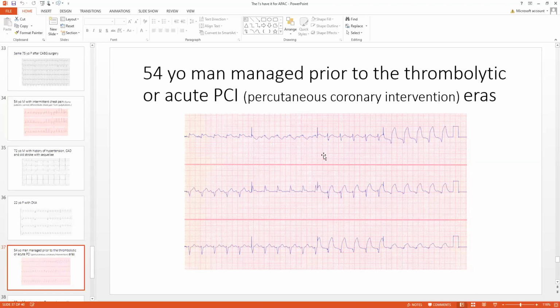The patient's got an anterior infarction, not a septal, anterior infarction. It involves the lateral wall as well. And you see that there's tachycardia because there's so much myocardium that's been injured and that there's just no pump.